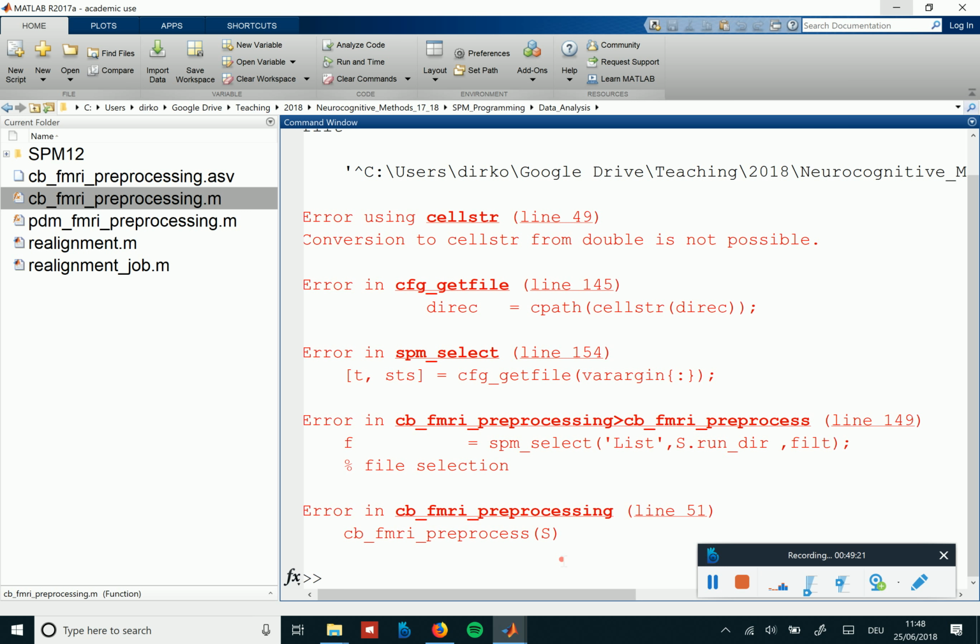So now we are selecting the original files and we want to realign them, and then the next step we want to select the realigned files and normalize them and so on. So it's hierarchical, and this code that I have for that is actually doing that automatically, and it's really good, but I don't get it adapted right now because I'm hungry. Good, then let's stop here. You have what we've done, and I will modify that so that it's also doing this, and then we can much more easily copy it within the script from now on once it works for the first thing. Yeah, good. Then see you tomorrow.